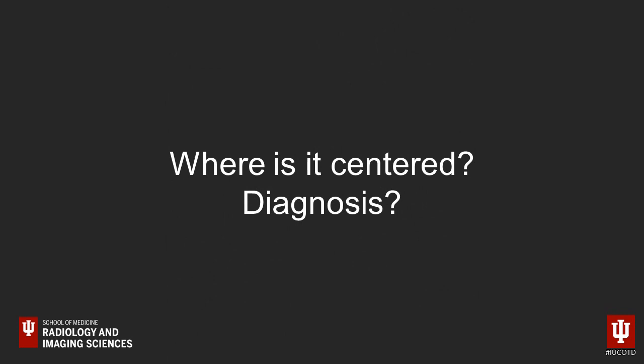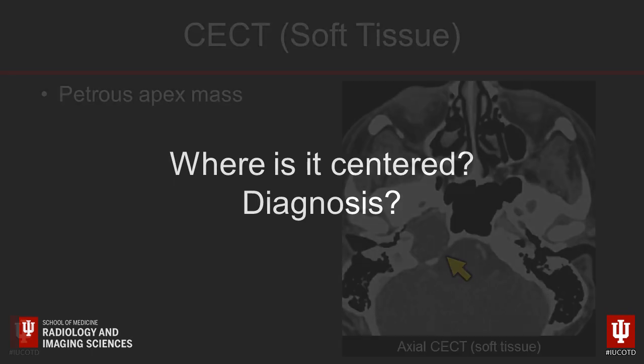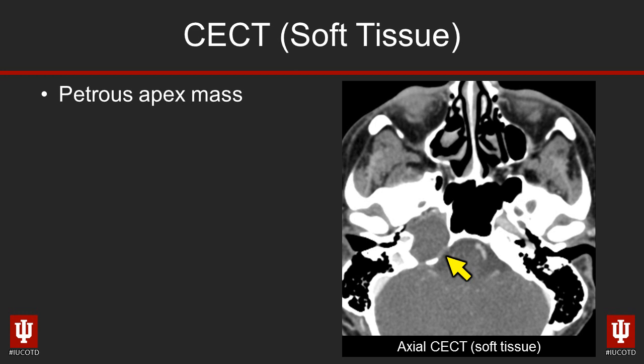Okay, I have 2 questions that pertain to this case. The first question is, where is this lesion centered? And second, what's your diagnosis? All right, so let's take a look at the imaging.